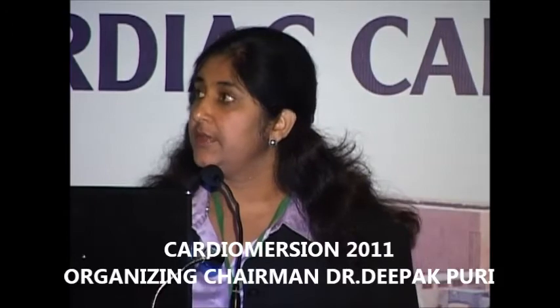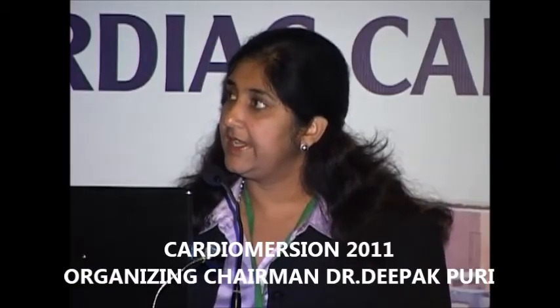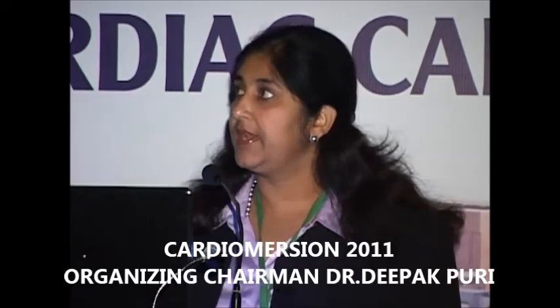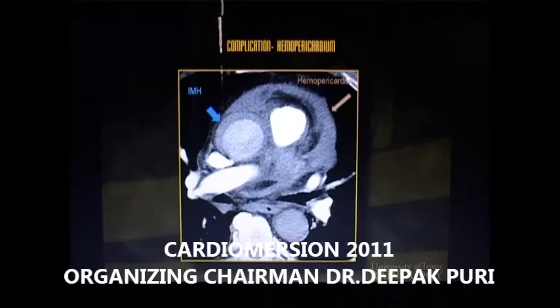Just a quick word about the complications. This is an entity which involves high mortality, so we have to be very careful. Acute aortic regurgitation can occur, which is mostly evaluated with echocardiography, but CT can be helpful in other situations, as in this case, where we see the ascending aorta and this crescentic hyperdensity, which is an intramural hematoma. There is also some pericardial effusion which was high density, and hence it was hemopericardium. This patient was taken to the OR in a timely manner.